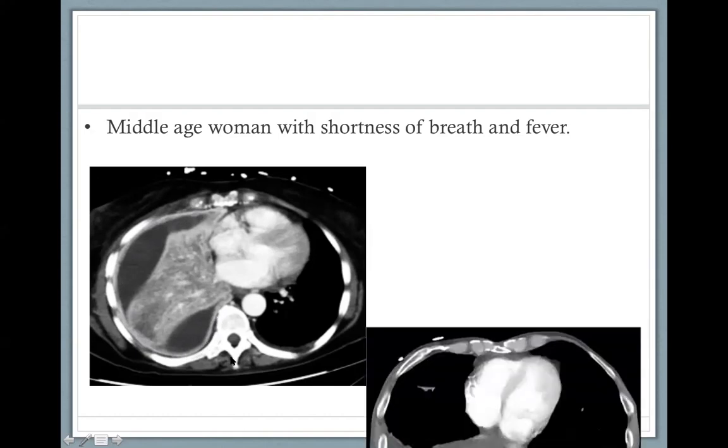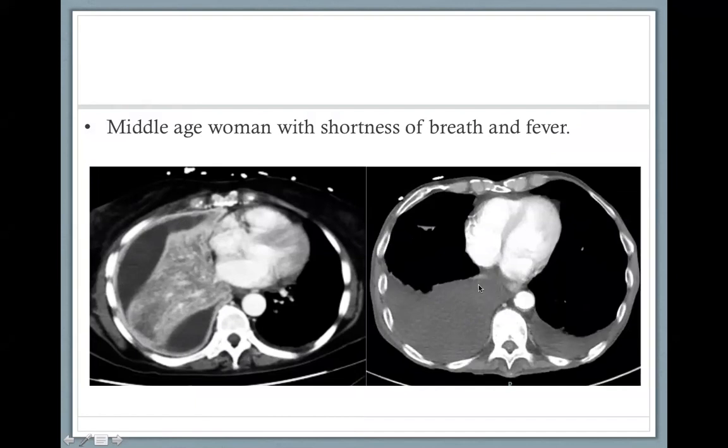And I'm going to show you here how a regular pleural effusion would look like. So this is a CT chest with contrast. This patient has heart failure and he has pleural effusions. But if you can see, these are pleural effusions without pleural thickening. So these are not infected or not complex pleural effusions.